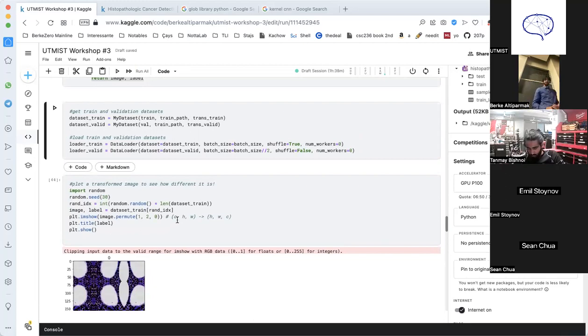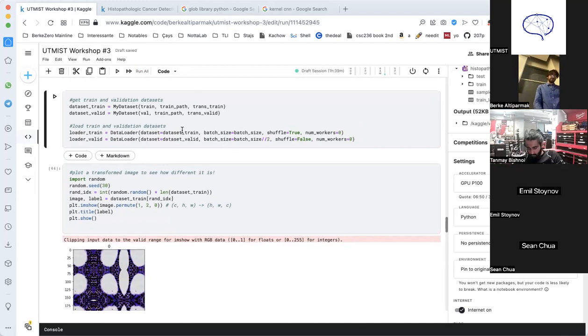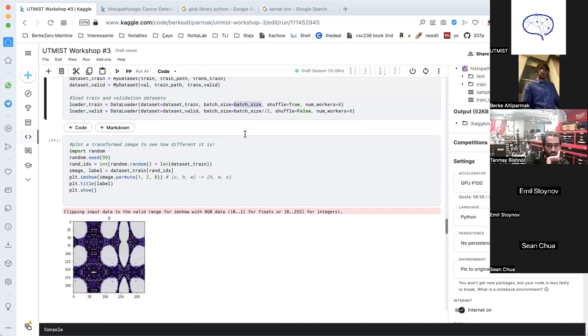So we have our images, we have our dataset, but we want to efficiently load our training data into our model. DataLoader is a very commonly used library in PyTorch in Python to load data. So we say load the train dataset, but we also mention that after each 32 iterations, improve the model. And we also enable shuffle, so the data is kind of random.